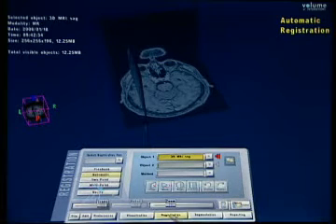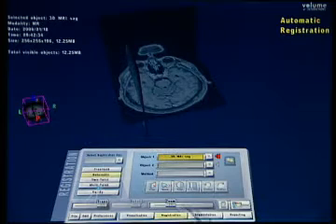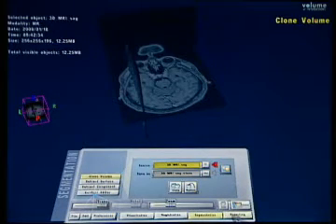Most of the data you're going to see tonight will be multimodality data, which is data consisting of CT and MRI and the different subgroups of MRI like MRA or MR venography. So in that interface, we have different tools to co-register the different imaging modalities. And then there's tools for segmentation, like volume cloning and manual outlining in case you have to, or algorithms to give you a threshold-based segmentation, sometimes completely automatic, sometimes semi-automatic if you have to refine something.